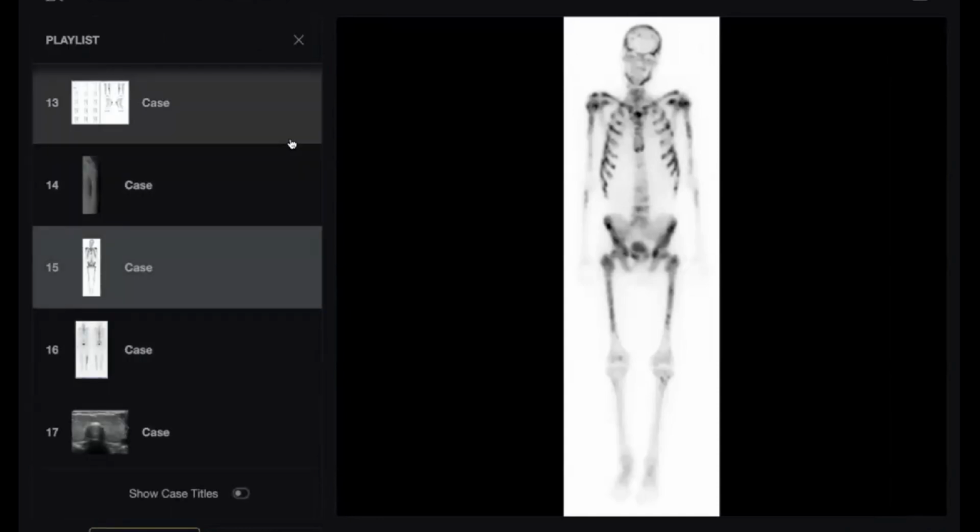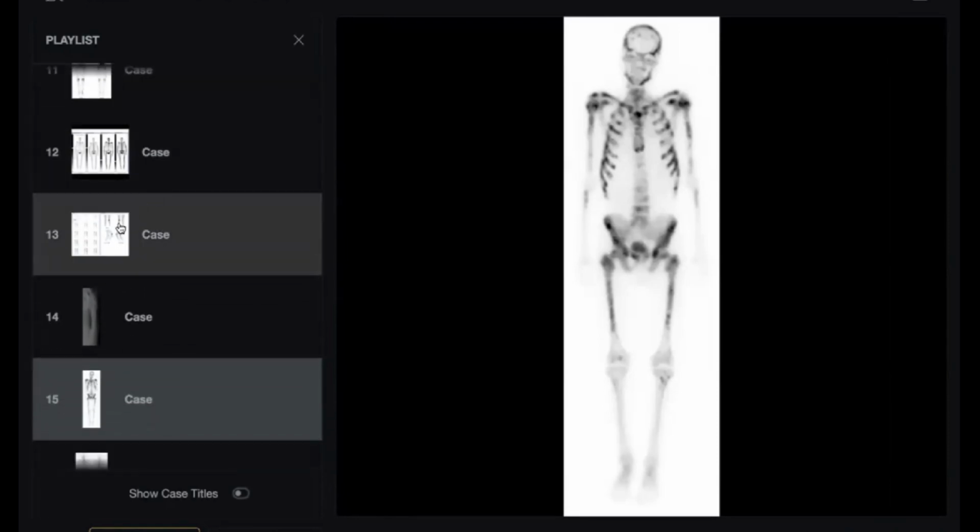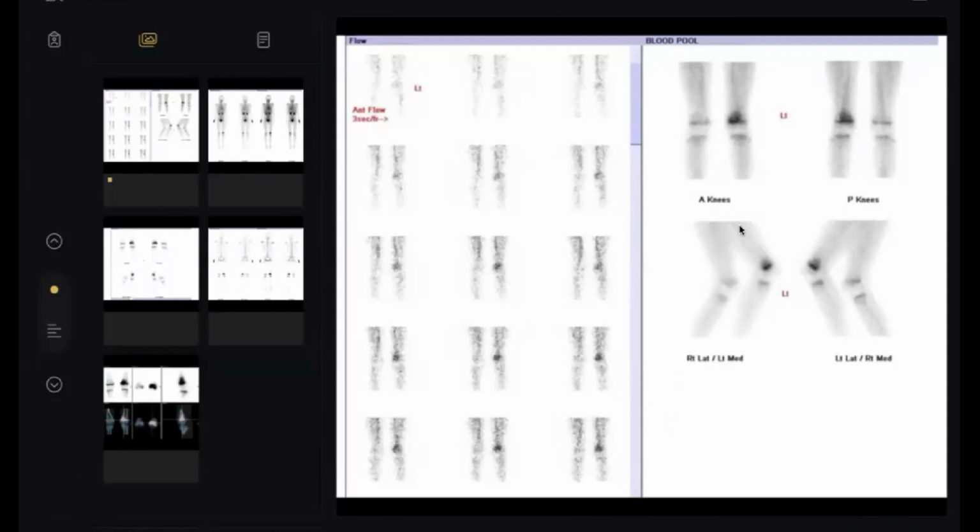By the way, because we are not familiar with nuclear medicine, it looks difficult. Here, this is osteomyelitis, and I have told you, sorry, this is not correct grammar. Phases 1, 2, 3, all phases, there is uptake. Even here, mild, moderate in the delayed phase, there is uptake. All of this is uptake. What is the differential diagnosis between cellulitis and the bone?